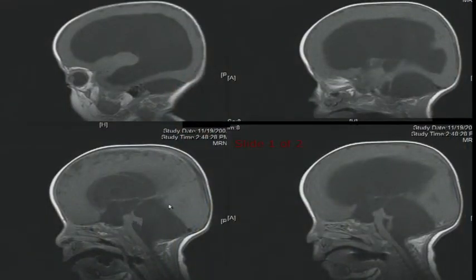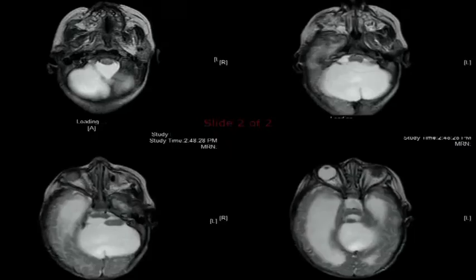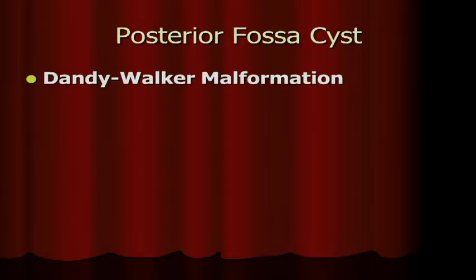So here is an MRI, and you can see this is part of the vermis. You can see the connection with this huge posterior fossa cyst. You get hydrocephalus: the lateral ventricle is big, the third ventricle is big. And here, this was bad Dandy Walker. Posterior fossa cysts are Dandy Walker malformations.